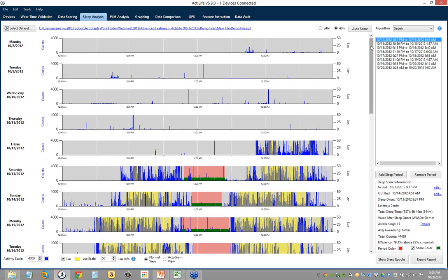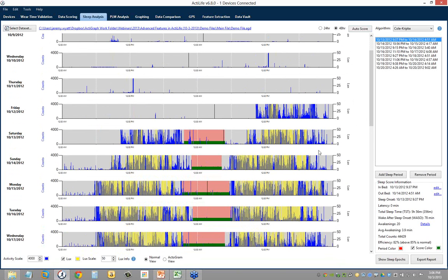What we're doing next to improve on this auto score feature is we're going to use one of these sleep scoring algorithms. In the updated version of 7.0, we'll score all of our epochs using one of these algorithms, the Sadeh or the Cole-Kripke, and then we'll go back and look at when we have a lot of sleep epochs versus a lot of wake epochs to do that estimation. By proxy at that point, we will be using a validated algorithm. But right now this is just our internal algorithm. It tends to be helpful for people who have large data sets, but it's there. It's a great tool.